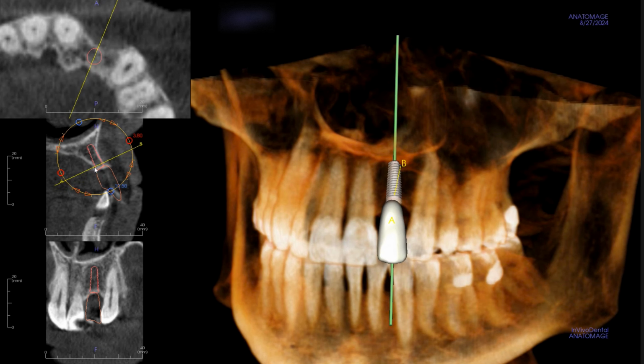this slice right here, which is this line, allows us to see where the implant is going to emerge in relation to the other teeth. And as you can see, that's rather palatally placed. In order for this crown to emerge from the tissue in a relatively normal looking fashion, there has to be a rather exaggerated emergence profile on the buccal, which, one, can look unnatural, and two, may not be the most periodontally sound situation.